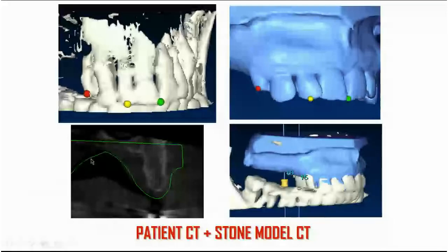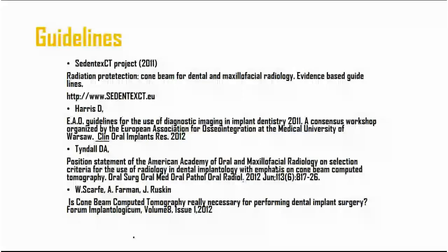We will be able to control if we did our positioning well, here, if the soft tissue position is in a good place, or the teeth are in a good place, and then we will have an overlap of the data, which will enable us to do the prosthetic planning, and to produce the guided elements for the implant surgery.